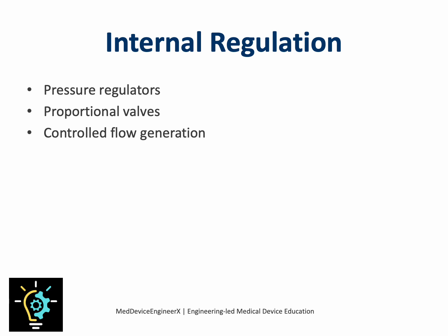From an engineering perspective, these valves are critical components. Contamination, wear, or calibration drift can affect flow accuracy. Understanding their role helps engineers interpret alarms related to volume delivery, pressure limits, and flow errors. The PB980 continuously monitors valve performance to ensure commanded flow matches actual delivery.